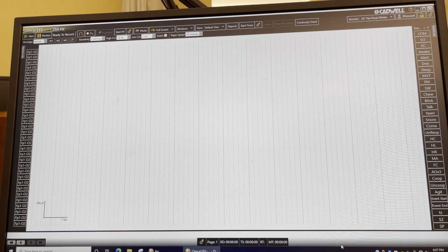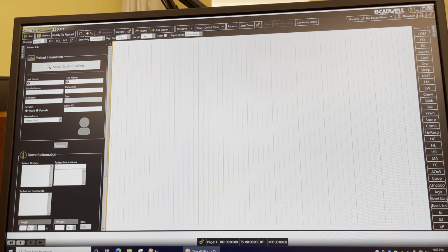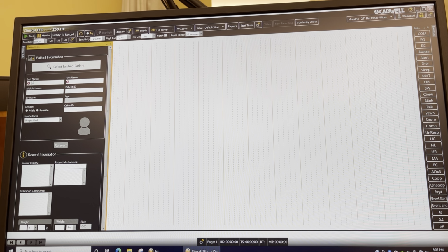And so what we're going to do is we're going to put in, you don't have to actually put in information. You can start recording right away if you wanted to, but we're going to go over the info. And so we're going to put in the last name. And then we're just going to leave it at that.